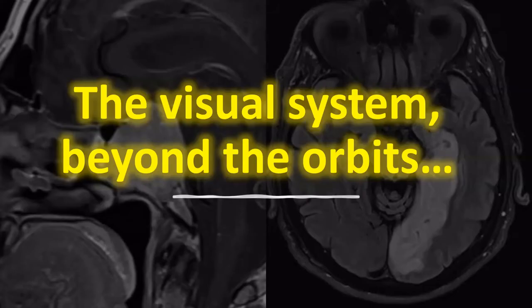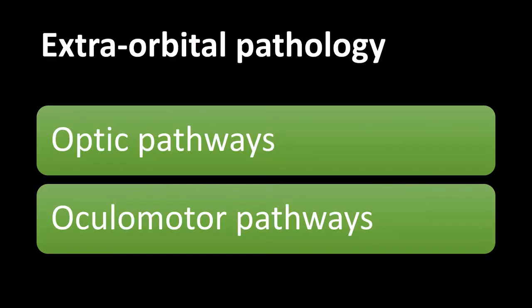Welcome to this last presentation on imaging of the eye, orbits, and visual tracts. So the previous presentations mainly focused on anatomy and pathology of the orbit. We talked about the globe, we talked about the conal, intraconal, and extraconal space, and so on. In this final presentation, we're going to leave the orbit and talk about the visual pathways beyond the orbits. So we're going to talk about the visual system as it is in the rest of the brain.